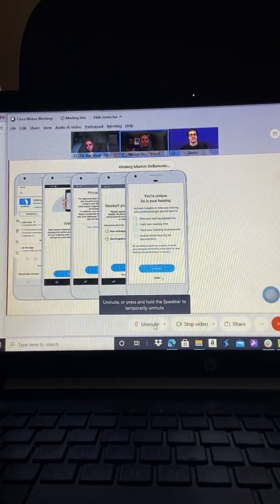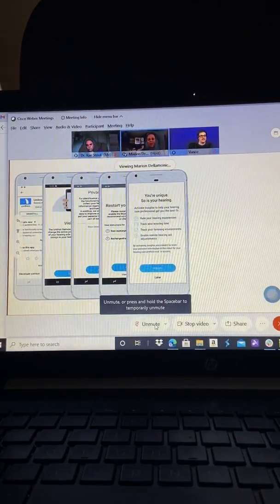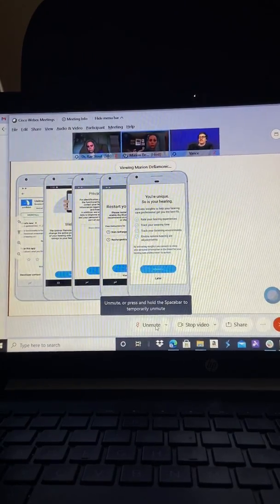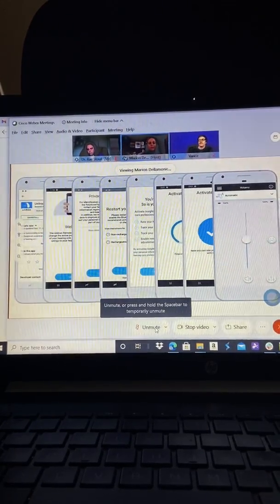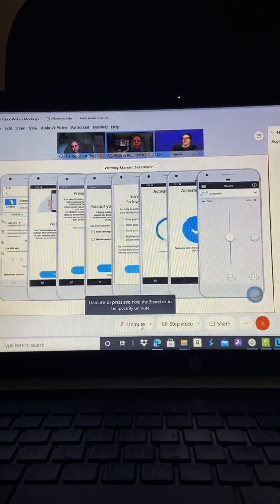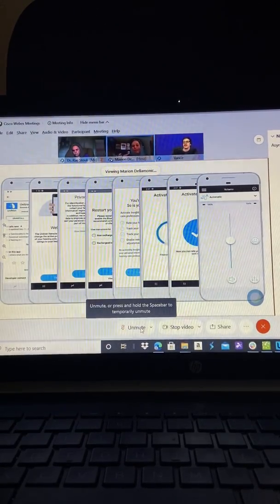No worries, I'm gonna advise you to click activate if you wanna use remote adjust, as well as 2 other features that we have that open up when you activate Insights. So all you do is click activate here. You get a check mark that's done, and then you also get this smiley face that's for ratings, which I know we kind of started talking about, but I'll fully flesh out for you guys today. But ratings, that little smiley face, is how you also know in the app that it's been activated.